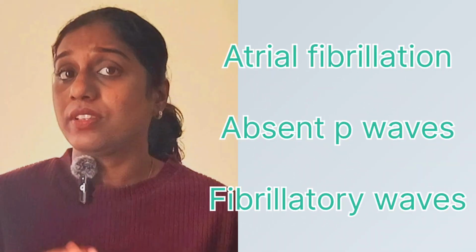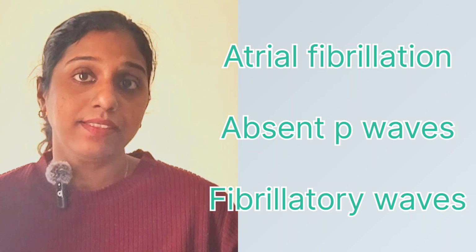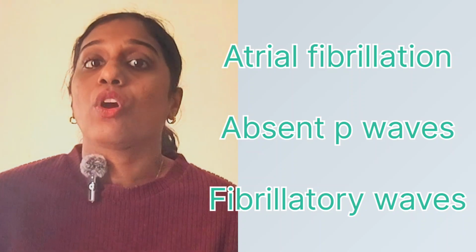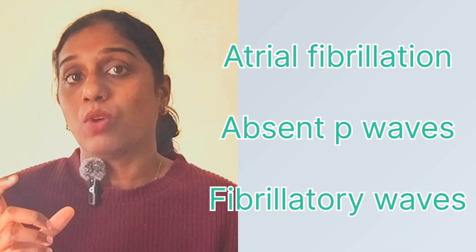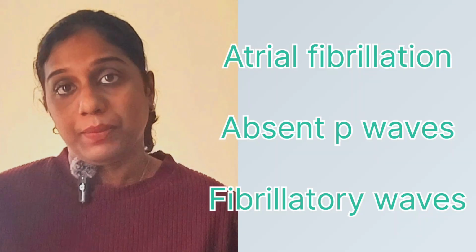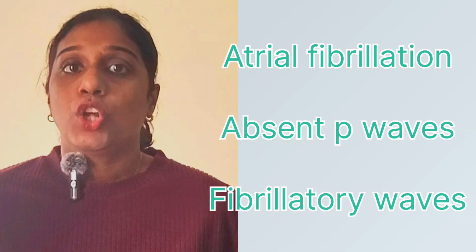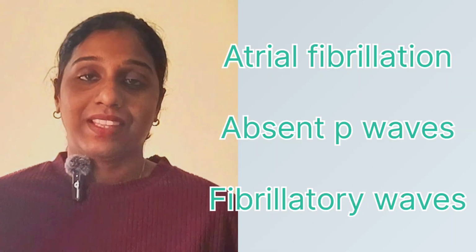That is because no organized atrial depolarization takes place, so we will not get a P wave. We'll get an absent P wave in case of atrial fibrillation. Instead, we will get fibrillatory waves. So that's all about the P wave.